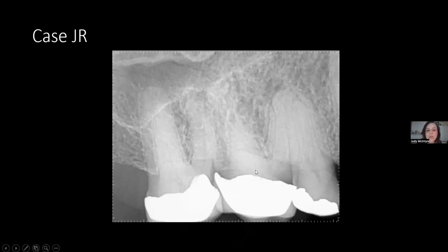And this patient had recently received a crown on tooth number 3, the upper first molar. One thing I would like to encourage you all to do whenever you're replacing a large restoration or a symptomatic medium to large restoration, and especially always when you're going to place a crown, please, please, please take a PA x-ray before you place the crown.